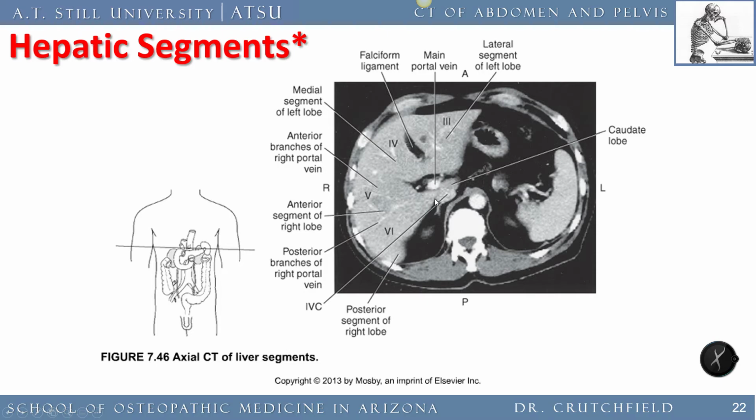Cava is right here. So these segments of vessels out in the periphery are most likely branches of the main portal vein. Those branches we're going to see coming into the vena cava, the hepatic venous system, the hepatic veins, are going to be up even higher than this.